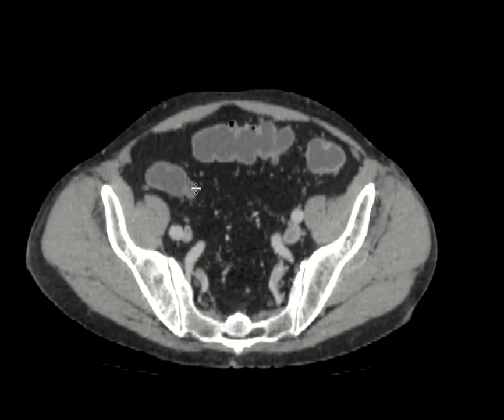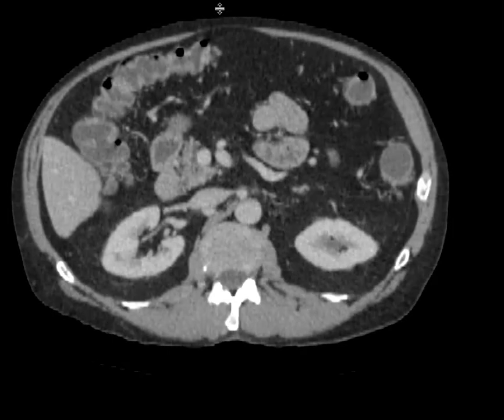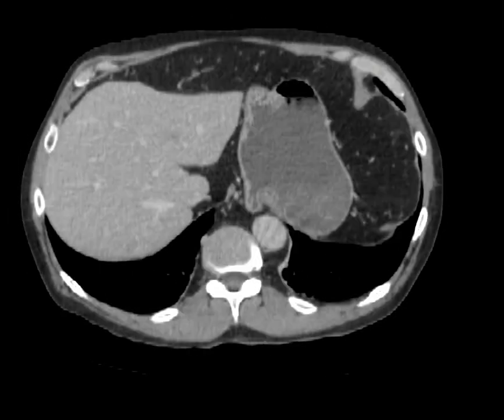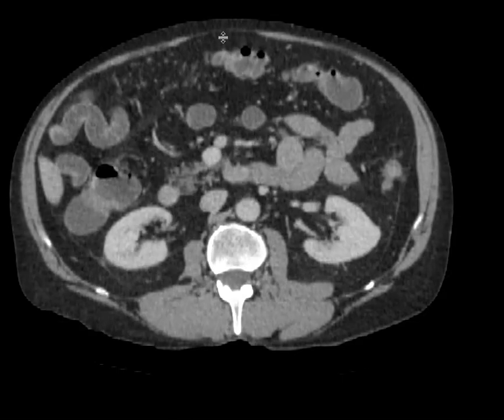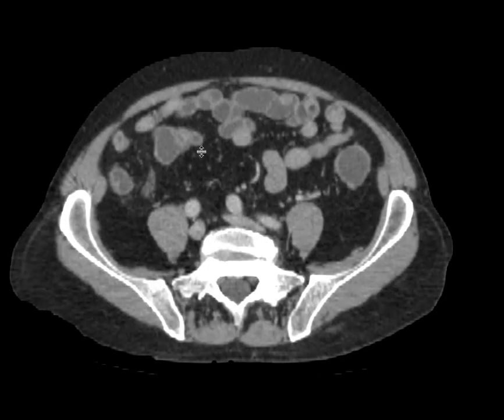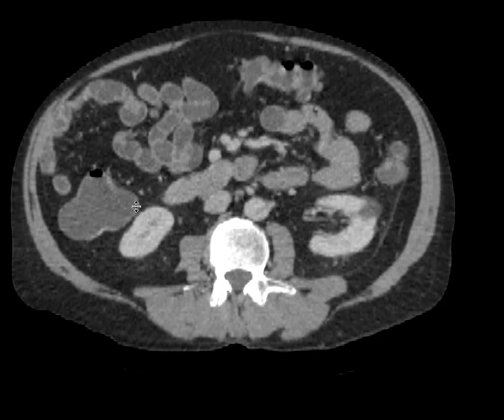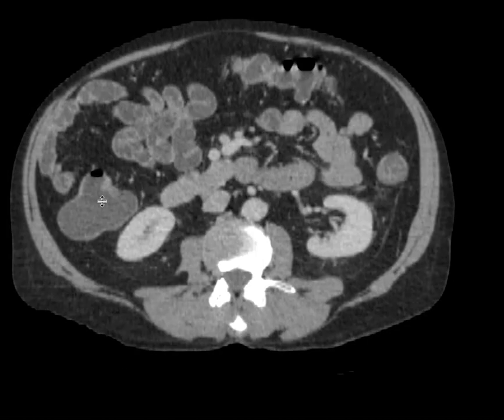Here's a CT that was performed on a patient with umbilical or periumbilical pain. And so the CT of the abdomen pelvis was performed with contrast. The predominant finding is going to be in the right lower quadrant. And if we focus in on here, here's our right colon. It's actually fluid filled, which can be consistent with the diarrheal state.